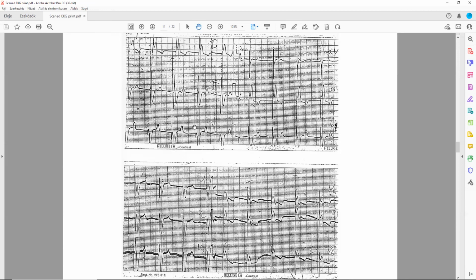So far, so good. Last time I thought it was rhythmic, but it wasn't, so I'm really going to look at it. That's rhythmic. For sure, it is rhythmic. Yeah, I thought it was rhythmic too. One second, let me just count.